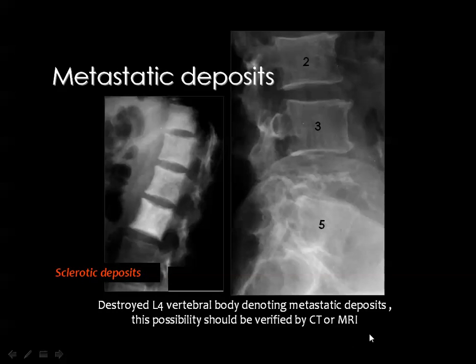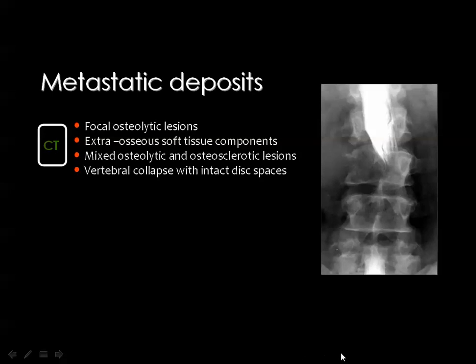Then complete destruction or partial destruction of one of the vertebral bodies in an adult is highly suggestive of metastatic disease. And also, if you see multiple sclerotic vertebrae, unlike this solitary sclerotic vertebra, which is for the differential diagnosis I mentioned, and you think of metastasis as the first possibility, then this is the pedicle sign, and you see here that this pedicle is present, but this pedicle is absent.